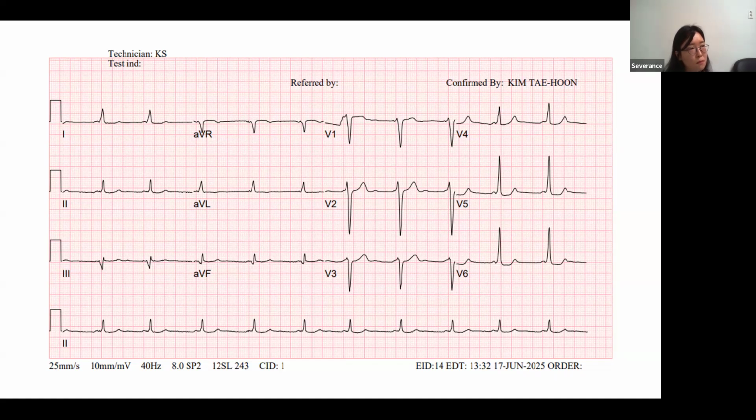And if it is really a septal bypass tract, how to think? Negative delta in lead 3, and minimal negative delta in AVF. So if only negative delta is showing in lead 3 in a patient with a septal bypass tract, that is a mid-septal accessory pathway.